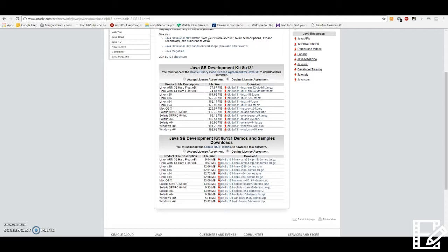Note its location. You also must have the Android device you're installing the app on and a USB connector for it. First, let's install all the software we need to run this system. If you do not already have the Java Software Development Kit, go to the Oracle website to download the installer for the latest version. Download the version that matches the operating system you are using. Open the installer and follow the instructions to install a basic installation of the Java Software Development Kit onto your machine.